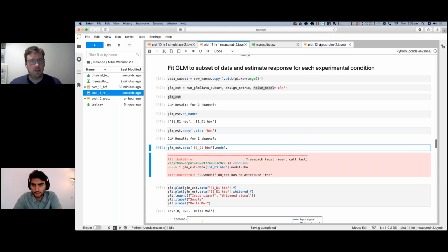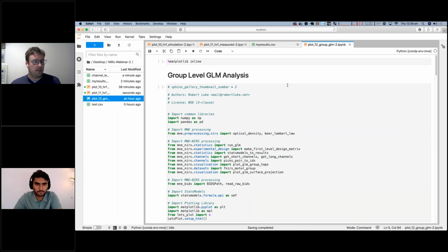All right, we'll move on. So the group level results. Okay, so that's how you analyze a single participant.